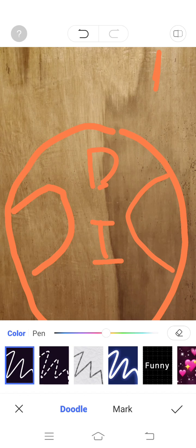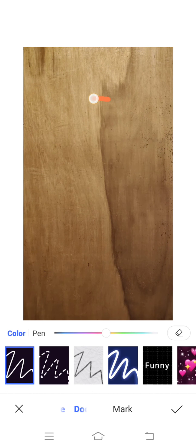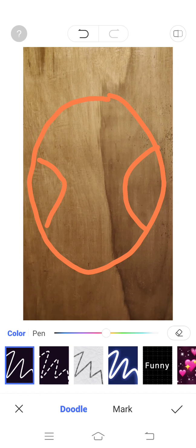Hold on. Okay, let's do this again. Oops. Okay, so this is the lens. There's this distortion area here. Okay, this is for the distance vision. This is for the intermediate, and this is for the reading.